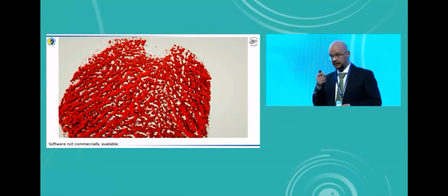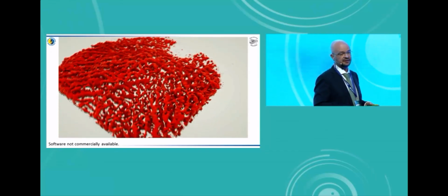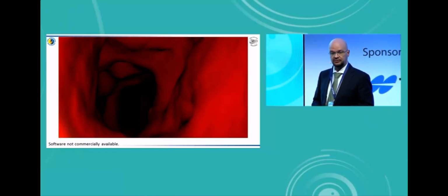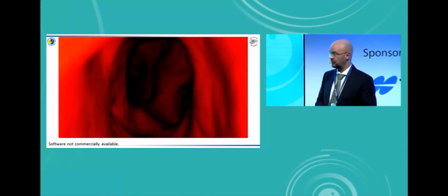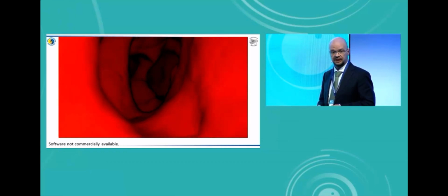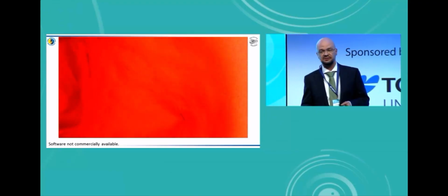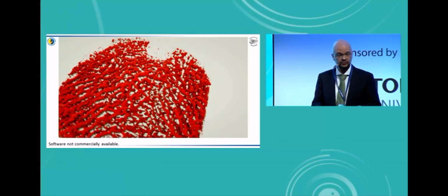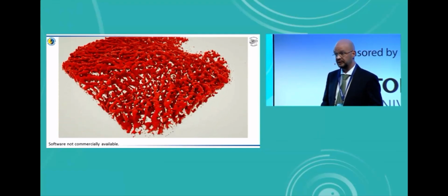Just like before, it's possible to take that information and to create a triangle mesh segmentation of it, just like I had done with a choroidal neovascularization. So in this case, this makes it possible to fly through the single vessels and see what's going on. So these are the actual vessels of a patient that came to our clinic, something I was doing with Professor Drexler. Now, you're looking at this and you're saying, oh, this is a neat picture, but it has clinically absolutely no use whatsoever. And I agree with you completely.